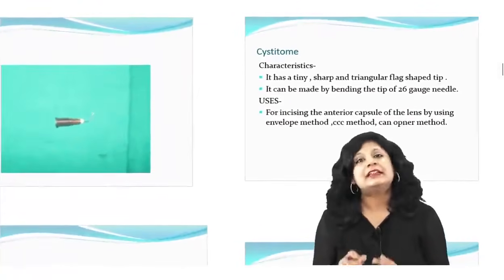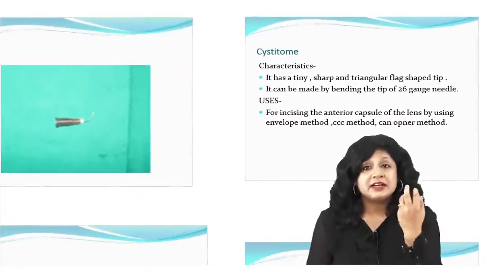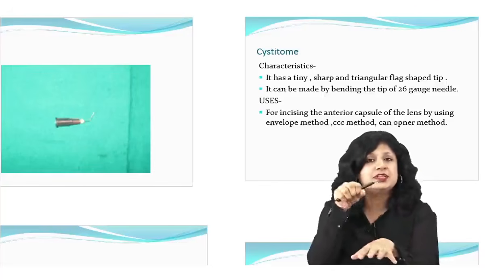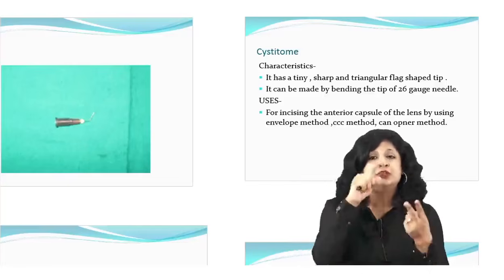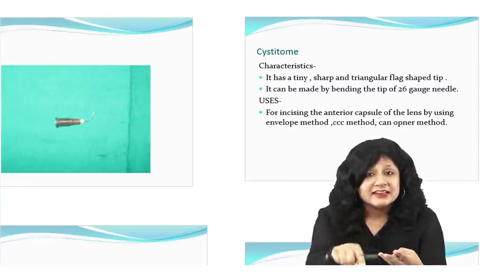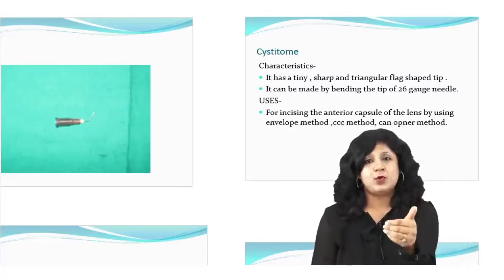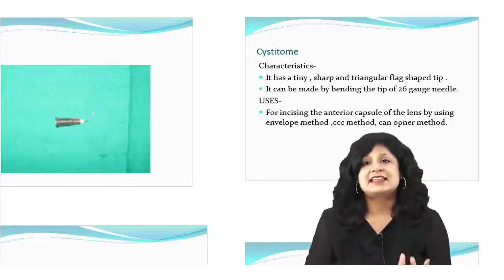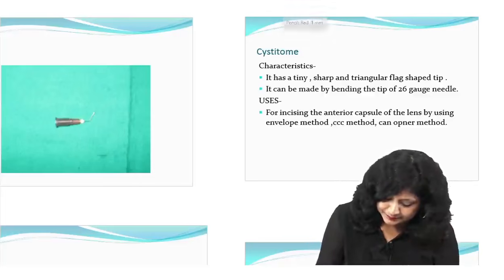Now another thing that you require in cataract surgery, like you have given the incision. First of all, can you follow the steps? We have used the superior rectus holding forceps for passing a bridle suture. Then you have given the incision, you have made the gutter, then you have made a tunnel with the help of a crescent knife. We also have made the side port entry with the help of a 15-degree blade. Now what next? Next is your capsulotomy. Right. So what do we do there?